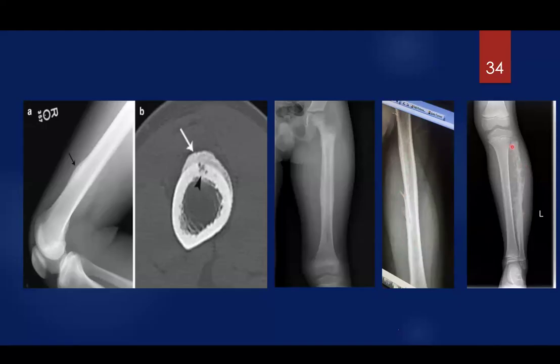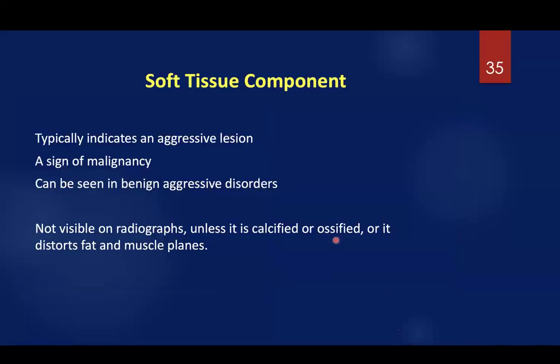And this patient also, that we treated 2 years ago or 2.5 years ago, you could see the spiculated or the sunburst appearance here. And this is a very aggressive looking periosteal reaction, a Codman triangle down in this area and also in this area. So this is the way you differentiate between a solid or buttressing type benign bone lesion and a malignant looking bone lesion with Codman triangle and multi-layer periosteal reaction.